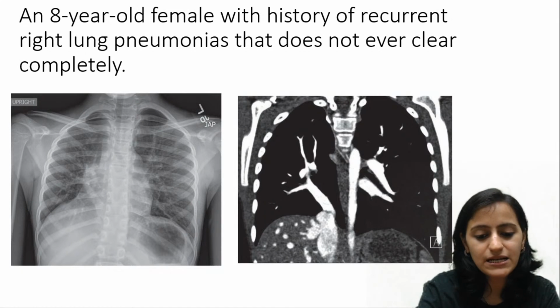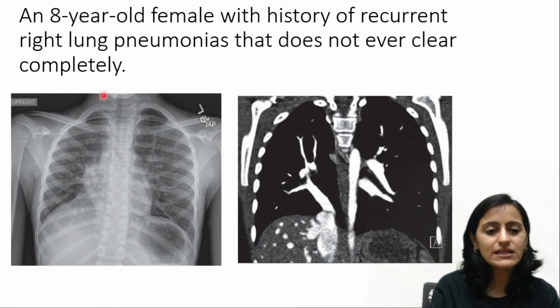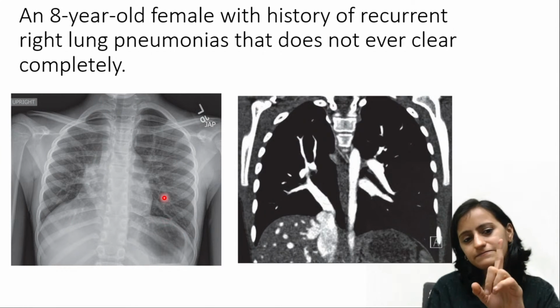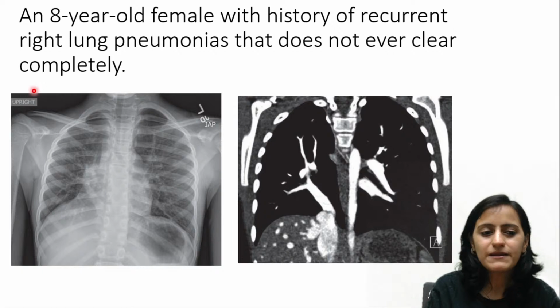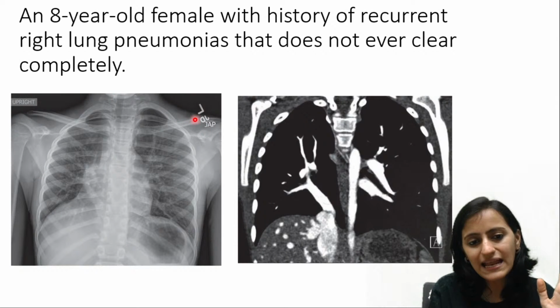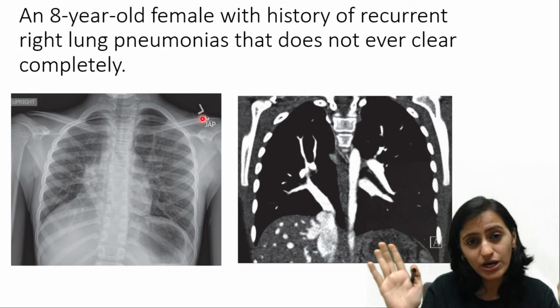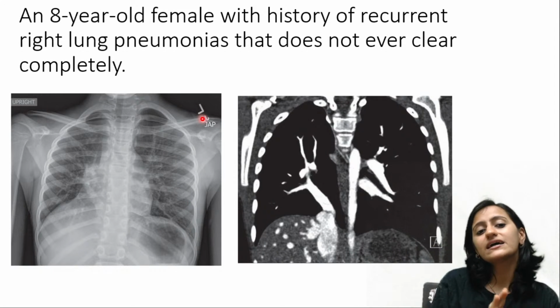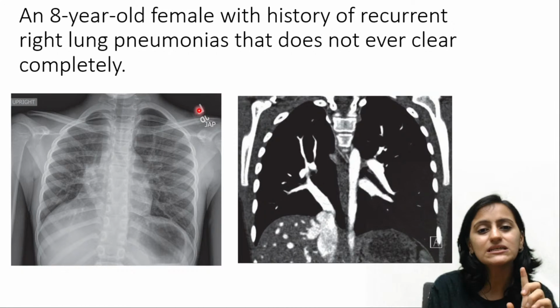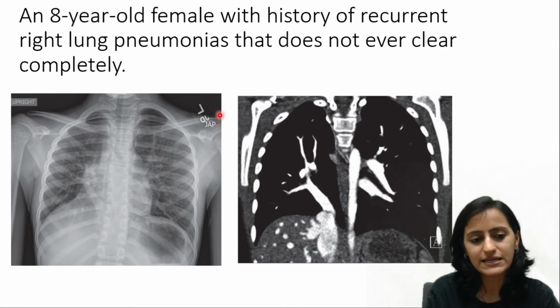Look at the X-ray, look at the CT scan. So in the radiograph, okay, in the radiograph. First of all, one thing that I want to clear here, please remember that this is the X-ray which is placed normally. Your L is on the left side, that is your right side. Whether the L is straight or inverted does not matter. The L has to be on the left side of the patient, that is your right side.